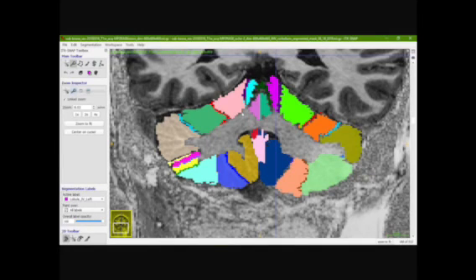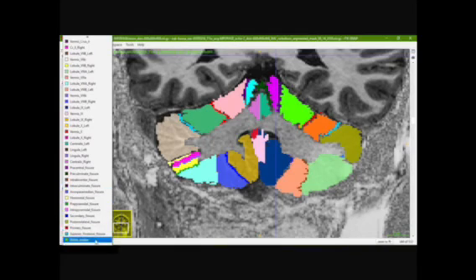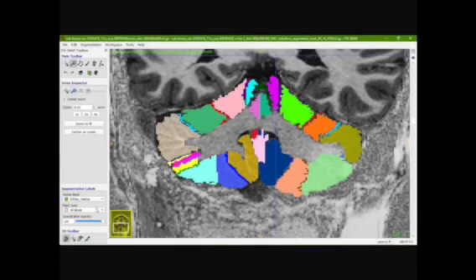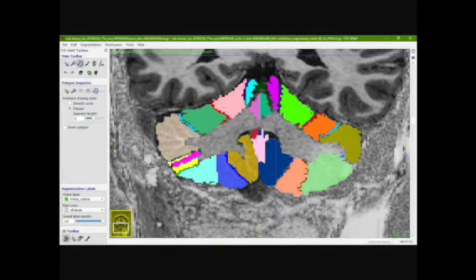And here I am going to use my white matter label. I am going to click on that, and then there are different features. The first one is the polygon mode, and if you click on that, let's say that we are going to select this white matter. So you are just going to do the outline of the white matter, right?